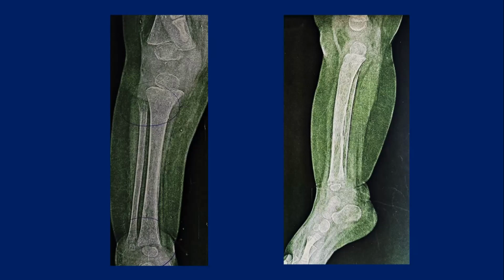Yeah, true. Because sometimes you may even have metastasis from neuroblastoma or something, metaphyseal lesions. Even the proximal tibia is good. It is only the distal tibia and the proximal fibula, and the fibula especially looks aggressive. So just thinking mets from neuroblastoma or something like that, because the distal femur looks fine.